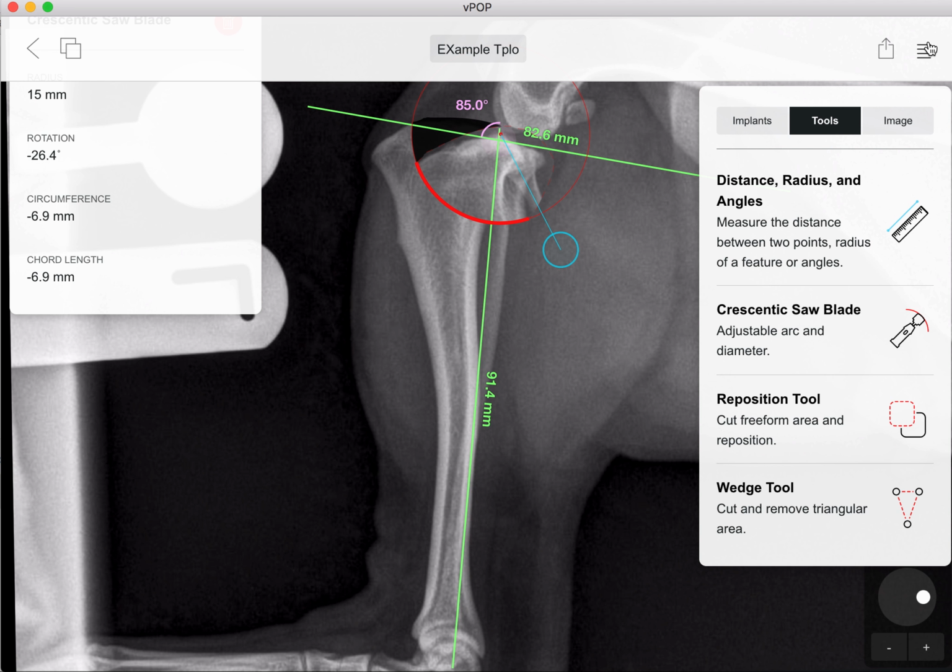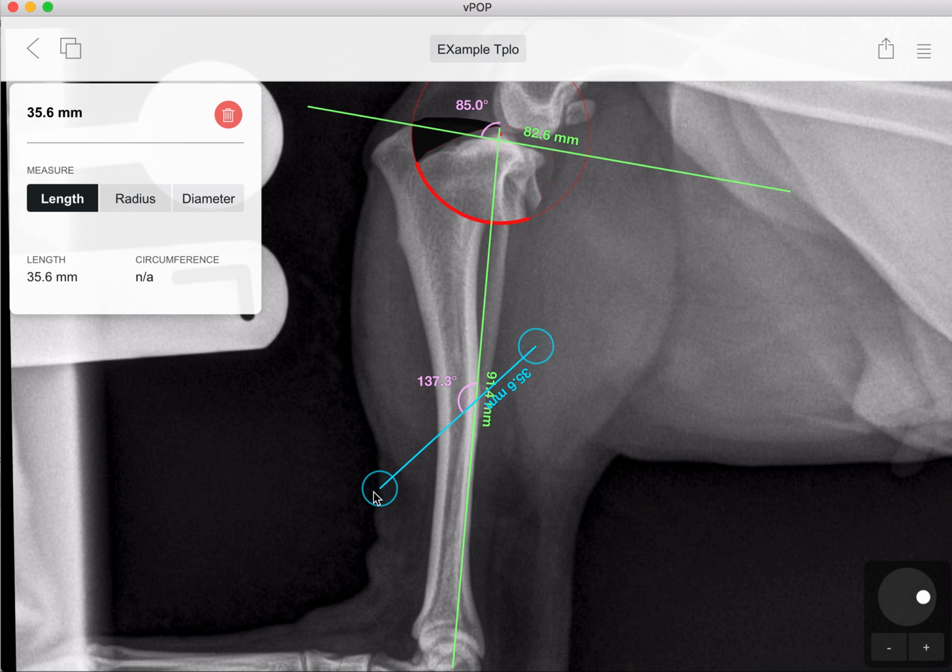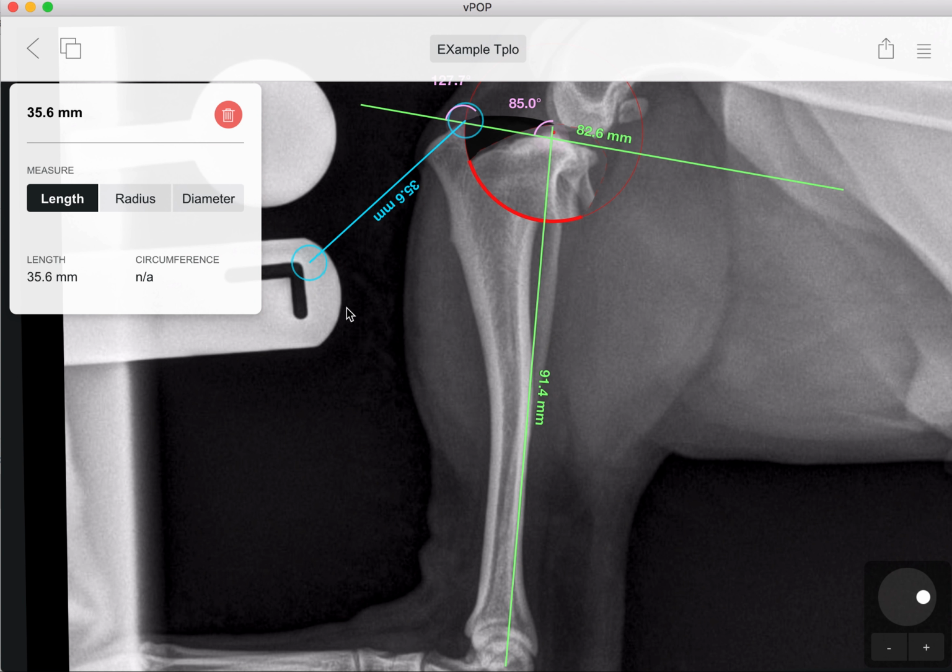And we can now measure our D1 and D2 by bringing up another line. And our D1 in this case will be 9.2 there. Our D2 will be 7.8 millimeters, and our D3, depending on how you measure your D3, will be 11.2.